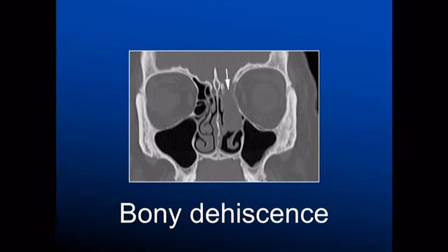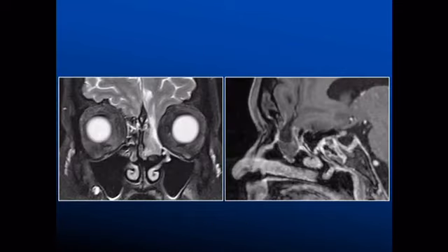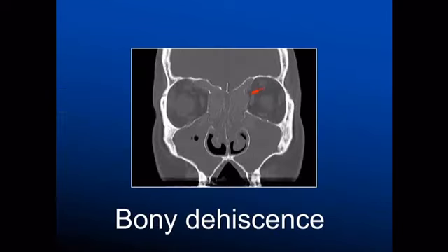So this was a patient who had some rhinorrhea symptoms and has this polypoidal lesion in the nasal cavity, and when we look at it closely you can see that there is dehiscence of the cribriform plate, and this was a nasoethmoidal encephalocele. Important not to biopsy that one.